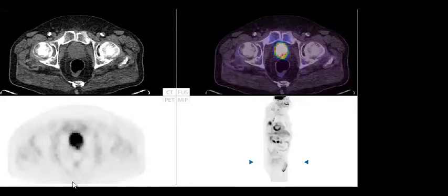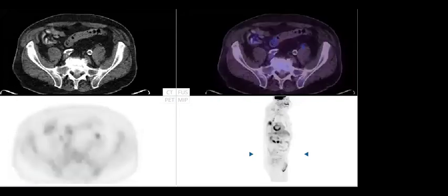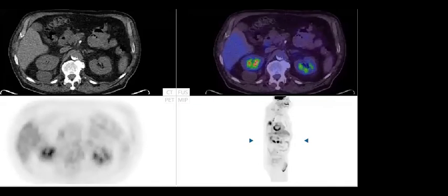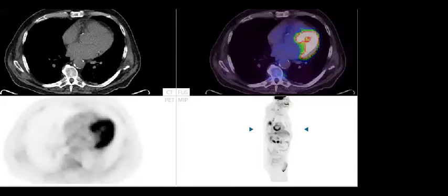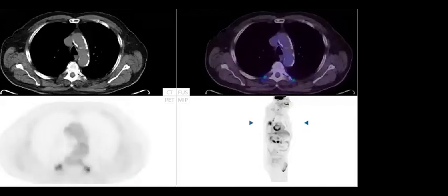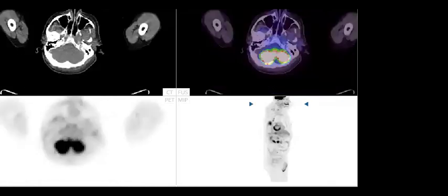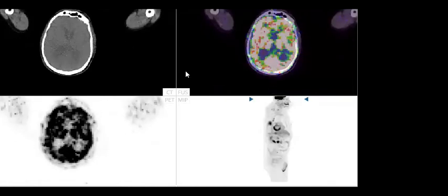Okay. So in this patient, the most important thing when you go through a PET-CT case is to know what is normal and what is abnormal, because you know that there are some areas, let's take the case from up to down, that should have uptake. So not any uptake in the case will be pathological. For example, let's go from the brain.